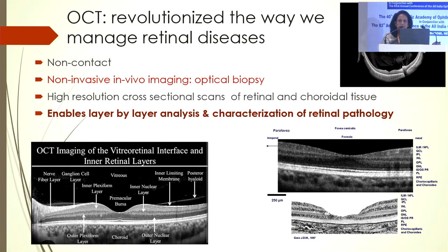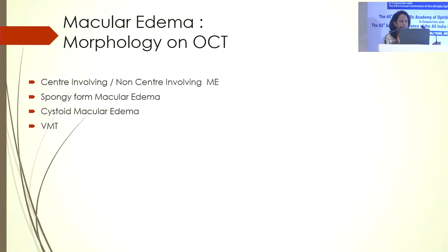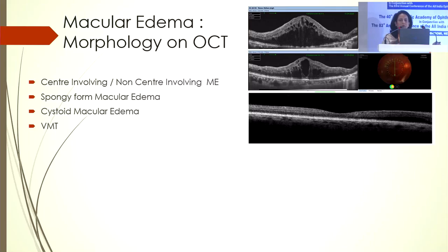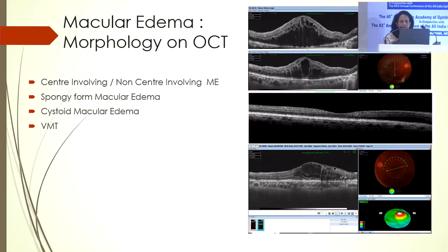The advantage with OCT is that it is a non-contact, non-invasive imaging modality in which we can study the retina layer by layer, and it enables us to characterize the retinal pathology in all details. Apart from the OCT biomarkers, OCT also helps us in identifying the morphology of the macular edema, and that itself guides us how we're going to treat the patient.